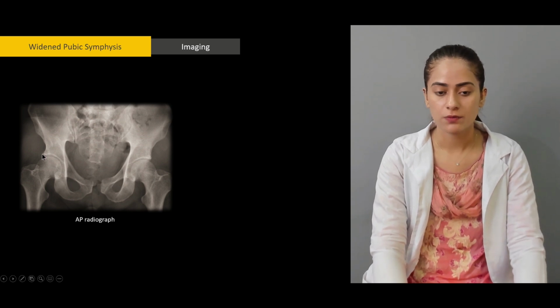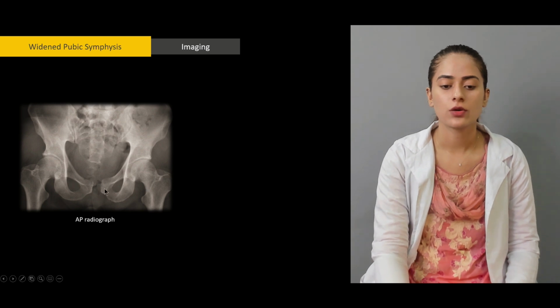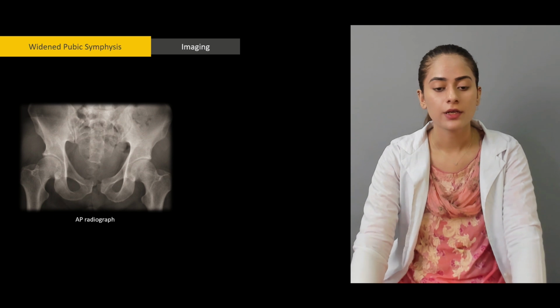So let's label it again. Ilium, ischium, pubis, sacroiliac joint here and here, so sacrum and coccyx. Then we have the femur, two femur bones, and this is where the pubic symphysis is, right? So this is cartilage between it, cartilage joining the two bones. Any wideness here will obviously be a fracture of that cartilage present between these two bones. The cartilage is obviously not visible on an X-ray or a radiograph.